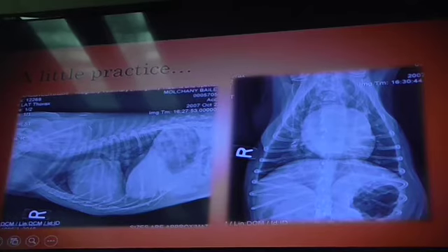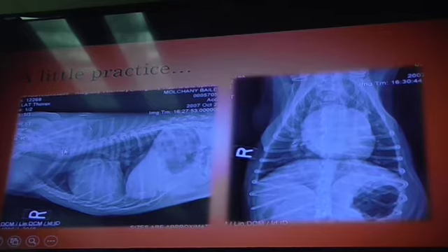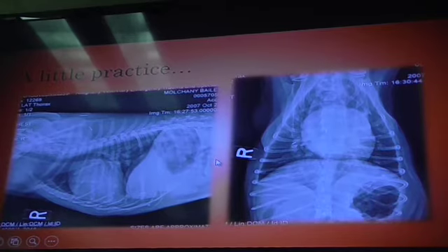Okay? So this is where Kim pointed it out the first time, she saw this vessel here. We call that the artery. We see this on this view. I can say that this is arterial enlargement on this view, because I have something to support that finding.